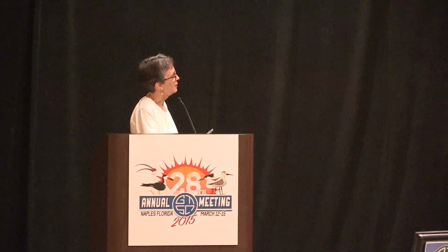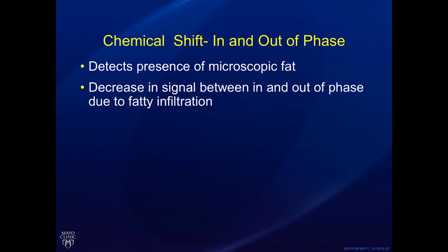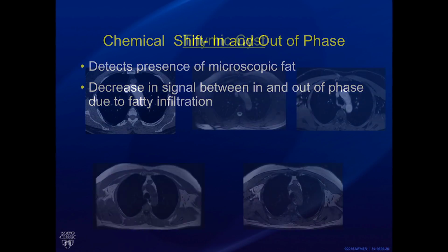Okay, so basically, the basic definition of chemical shift is that it detects microscopic fat.